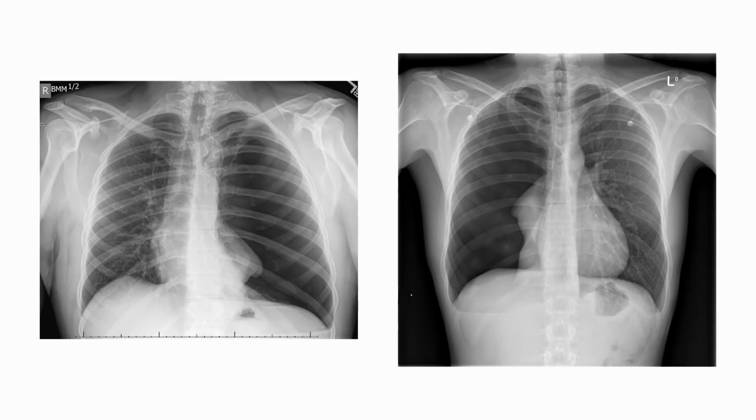Both these images are showing a pneumothorax. It may be spontaneous, it may be traumatic, and if you see there is some amount of tension developing, you need to put in a chest drain quickly. The algorithm for spontaneous pneumothorax has changed, so I would strongly recommend you visit the British Thoracic Society guidelines and look at the algorithm once again.